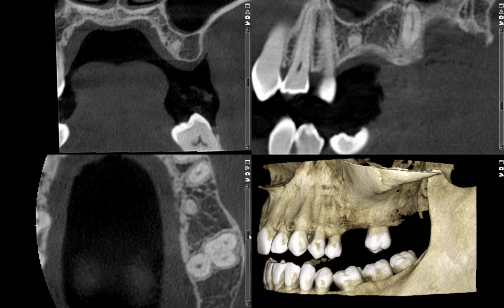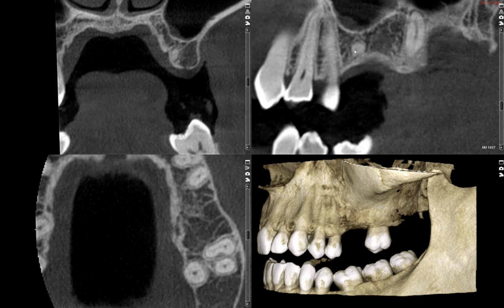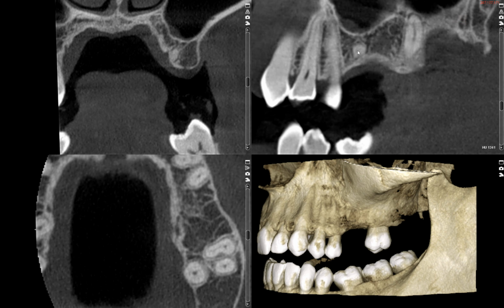Look at the shape and the location of this entity, as well as the radiodensity of this radiopacity. Does the density of this opacity look very similar to dentin of the adjacent teeth? Yes, absolutely, that's correct. So now I've practically given you what this is. This is a retained root tip. That is absolutely correct. If you saw that and guessed it from the beginning of the video, that's wonderful.